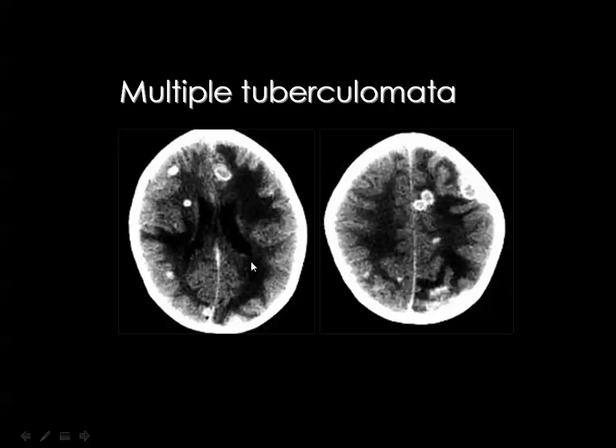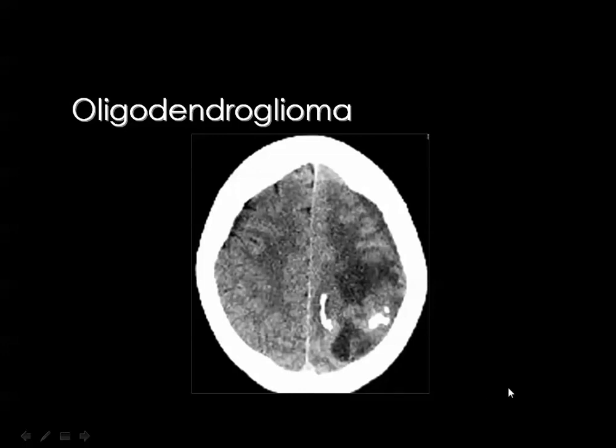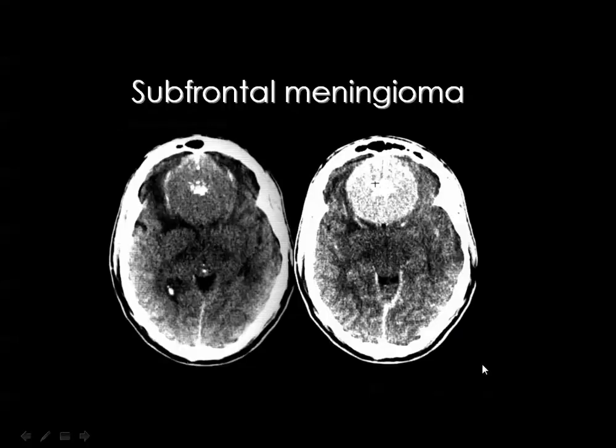And this is a good example of intracranial active tuberculosis, showing the typical buttonhole enhancement surrounded by evident perifocal brain edema. And this is calcium seen in an oligodendroglioma, a tumor located in the posterior high parietal area of the left cerebral hemisphere, showing matrix calcification.